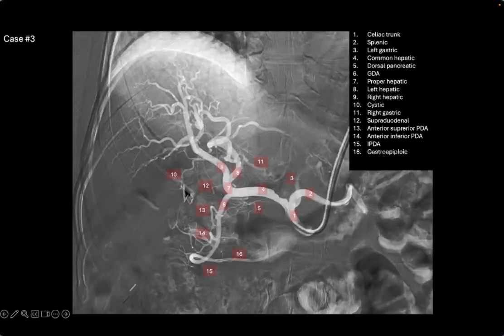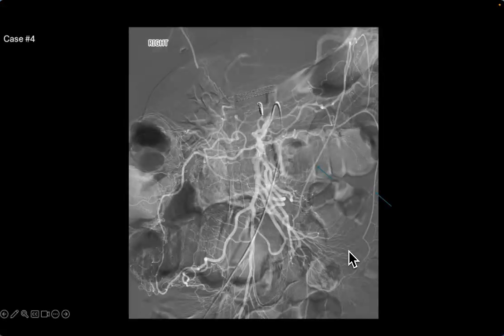So these are the exhaustive list of conventional celiac anatomy. Again, you probably are only going to be responsible for the major branches, but here's a celiac angiogram. All right, name the vessels that are labeled here. These are 2 vessels that are involved in forming collaterals, basically, between 2 arterial systems.